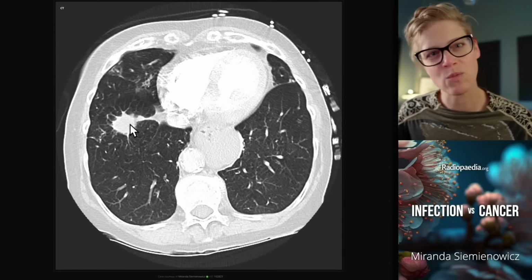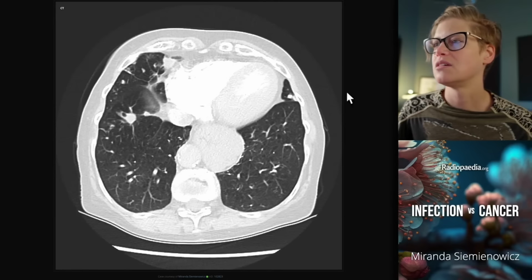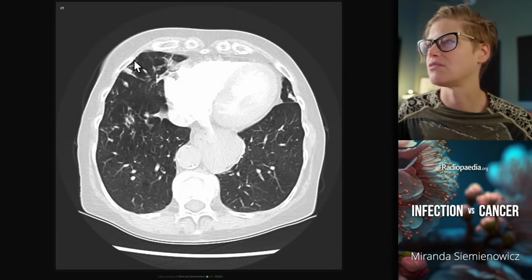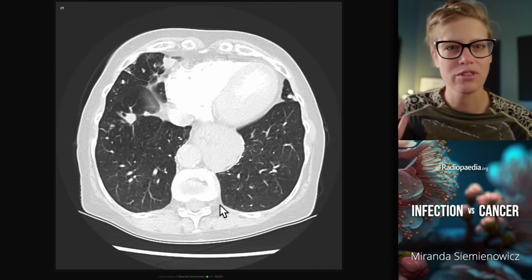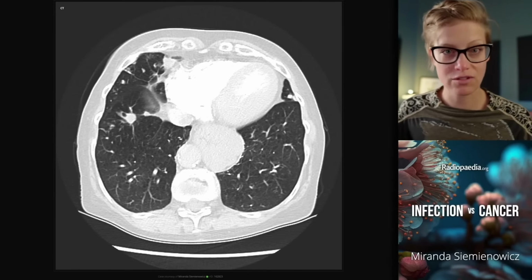And we know we can wait, and we do wait, and we wait for 6 weeks, and the lesion is decreased. This is an inflammatory process. The rest of their inflammatory change is worsening. They've got a moderate hiatus hernia, which is going to be contributory with a risk of aspiration. The patient needs a lung tune-up. They don't have cancer.